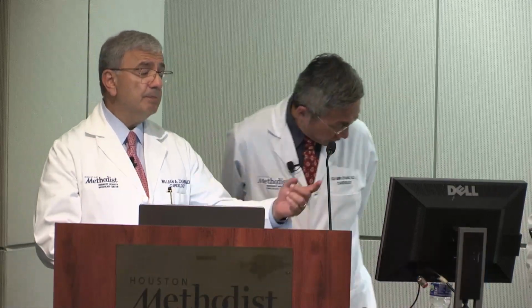And the size is important from a safety point of view. We published on these data: about 0.8 centimeter squared, at least by transesophageal, and above is high risk for embolization. So on the right side of the heart, easy decision. On the left side of the heart, you've got to see the extent and how large this thrombus is.